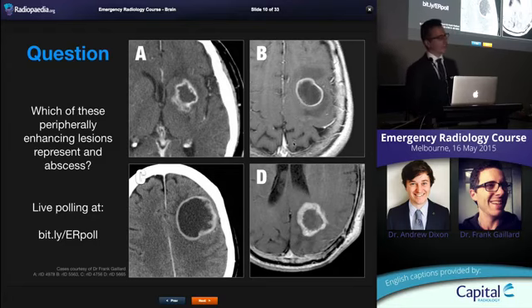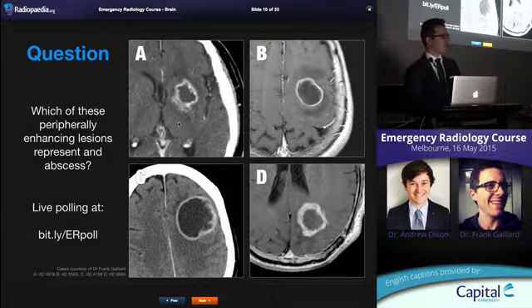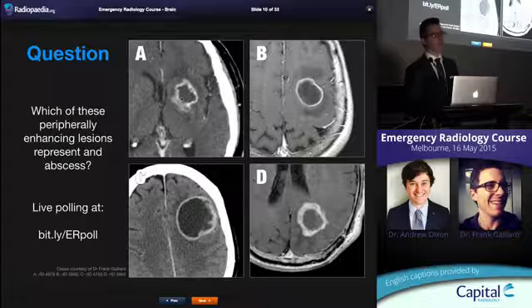And this is another situation where at the end of the day you need an MR and you need a radiologist to look at it, and even a neuroradiologist struggles with these on CT because you need the full set of imaging. There are a few clues though. This is located where you'd expect a basal ganglia hematoma to be, and if you go to the patient and get a history that 2 weeks ago they became hemiplegic, that's what it's going to be. These other ones are much harder.